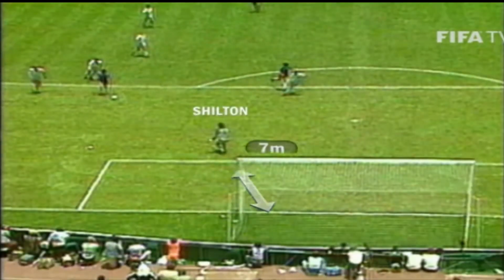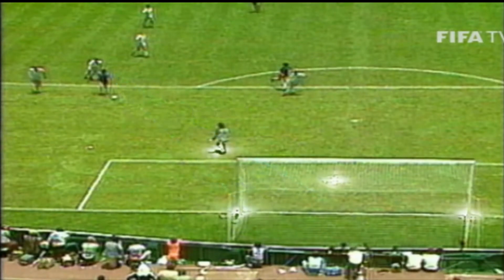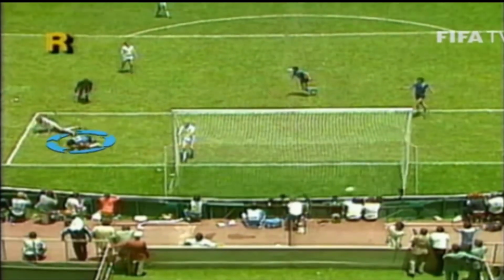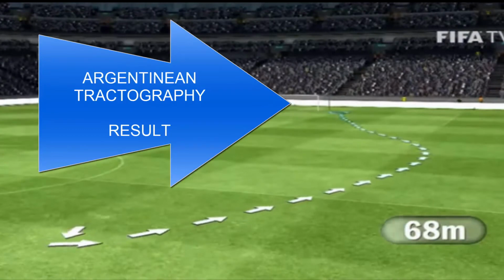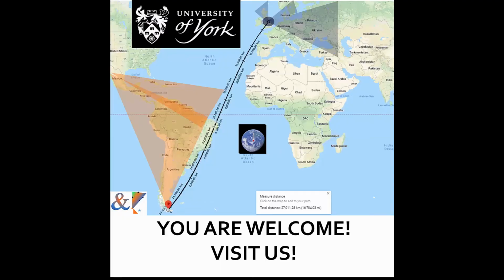This is a fasciculus that is a master in diffusion kurtosis imaging also. It's Diego Maradona. I don't know. This is the show. This is the pathway with a good fractional anisotropy.